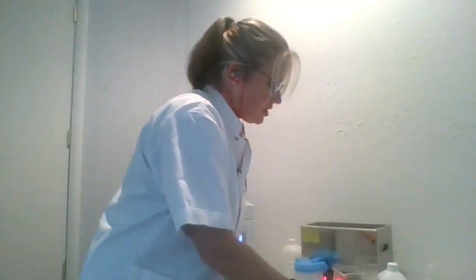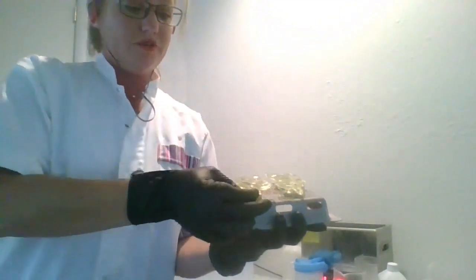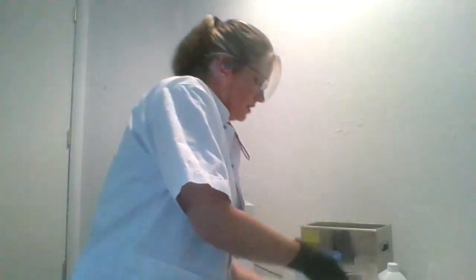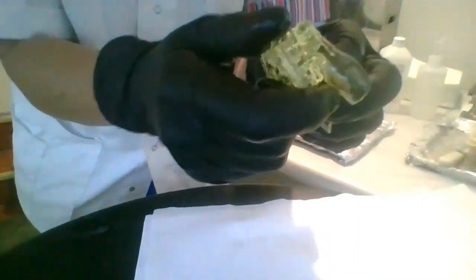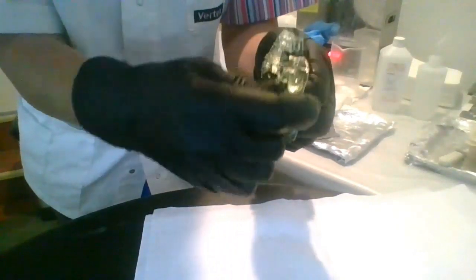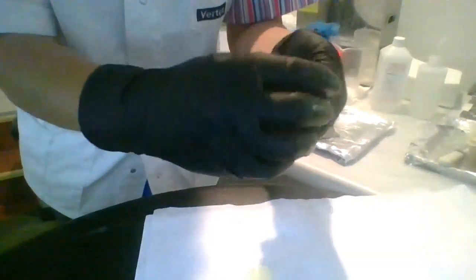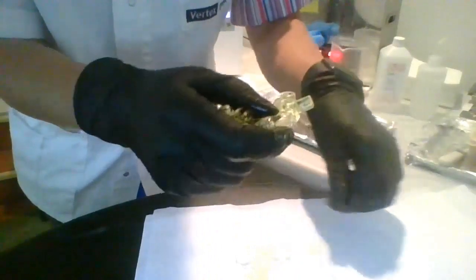Okay, perfect. So here, guys, I've just finished printing this one. And you can see that, again, we can still just pull off these parts. So you're going to see that when you pull off the supports, let me see if I can get you a little bit closer here. Can you see a clear view of this, Stein? Looks good. Yep, looks good. All right, perfect. So when you pull these off, you can see that they will pull right off without any recontouring.